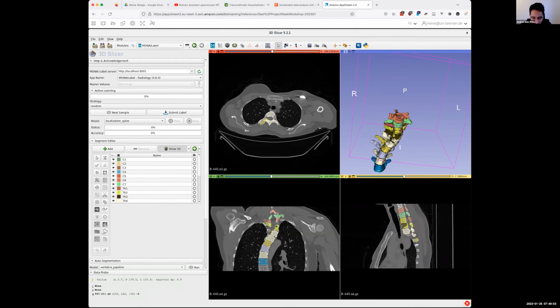We used only 60 annotations to train the model, and the reason for that is basically I just wanted to train the model and for you to see how that works and how it works for the TotalSegmentator, for instance, when you use the 1,000 volumes, right? So this means that this network needs more training and more annotation to get better. There was another question regarding the. I think you asked. Yes, I asked that. So you already answered my question.